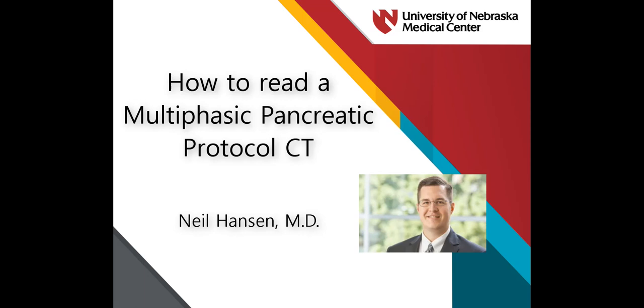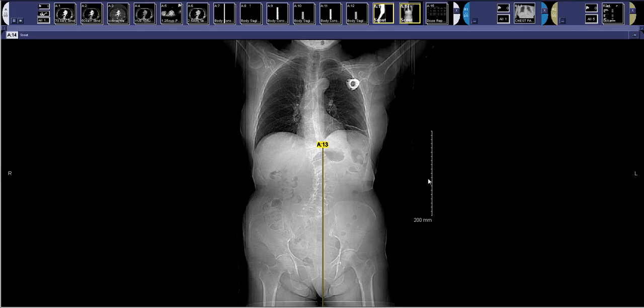Hi, this is Neil Hansen, and I am taking you through a multiphasic pancreatic protocol CT scan of the chest, abdomen, and pelvis. These are kind of intimidating studies. They usually have thousands of images. We do a lot of them here.